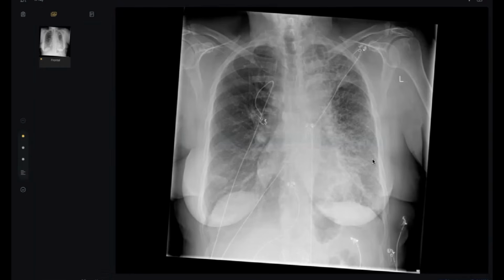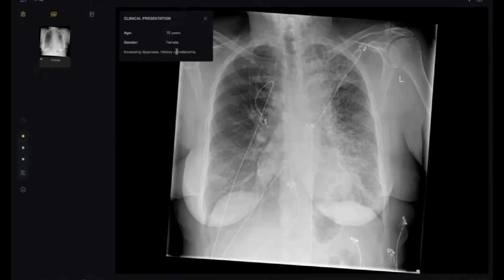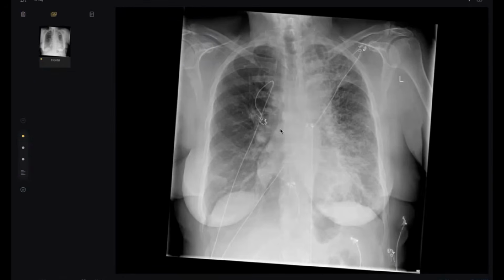This could be any history of radiation therapy. The radiation field will not be all over the whole lung. You are very near. What else? You wanted to ask something before radiation. Could be chemotherapy? Not chemo, something before both of them. One pathology. Look again, the patient has a history of melanoma.